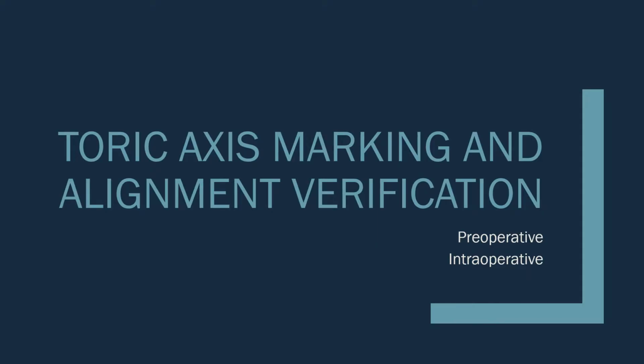So now we've chosen a lens and we know where it's meant to go. How do we go about achieving that? Well, this is where toric marking and verification of the alignment comes in.